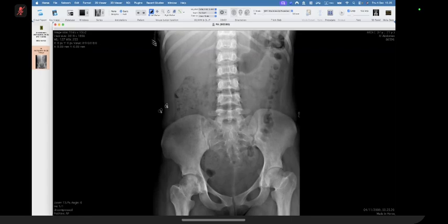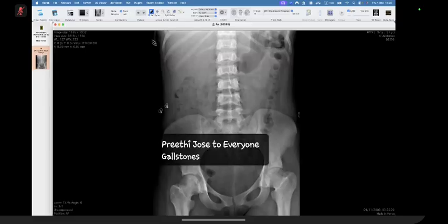Can I finish? Sorry. Yes. No, it's fine. Okay. Autosplenectomy is calcified spleen. Yeah. Okay. So not splenomegaly. You're right. You're looking for autosplenectomy. So there's no calcified spleen. That's one pertinent negative. The other pertinent negative is no gallstones.